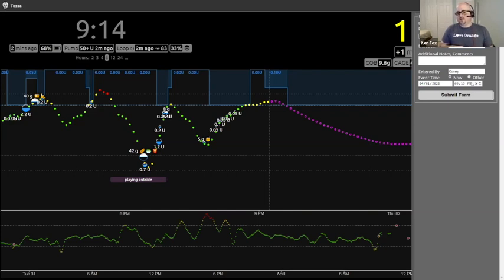So even if it's an indefinite override or one with a set time, like our going low one is set to 60 minutes, it fills it in here, but I can change this. I can make it 85 minutes. I can make it 30 minutes. And it will tell Loop to run that override for that specific amount of time. So that's always nice, especially if you think you're going to set a higher override to try to combat some carbs maybe that weren't entered for your child.